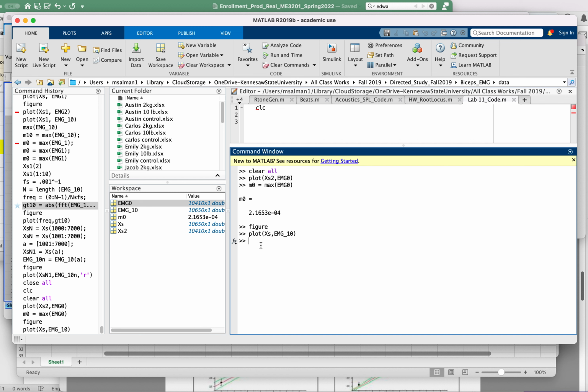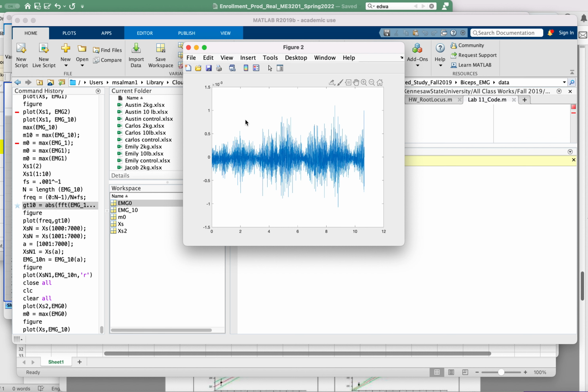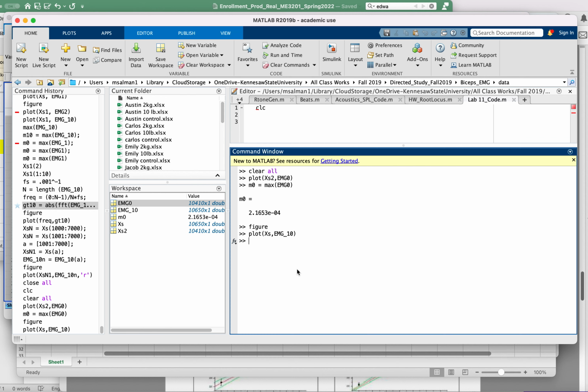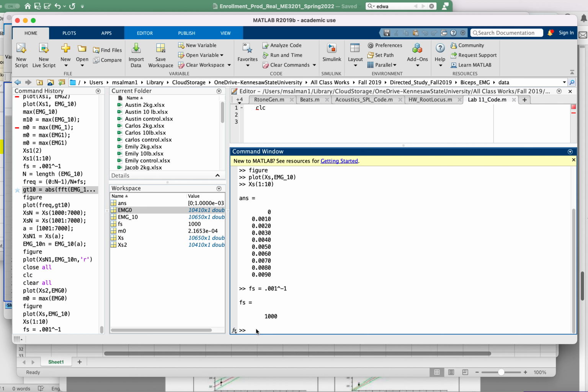In order to keep the same size, what I would suggest is you take, like, from 1 second to 7 seconds. I want to clip this from 1 second to 7 seconds. So let's see what the sampling frequency is. The sampling frequency is the inverse of the difference between 2 consecutive samples of the time domain signal. So it is 0.001, this is dt. So the sampling frequency is 0.001 inverse, which is 1000 Hz, so that's good. Now we can also plot the frequency axis.